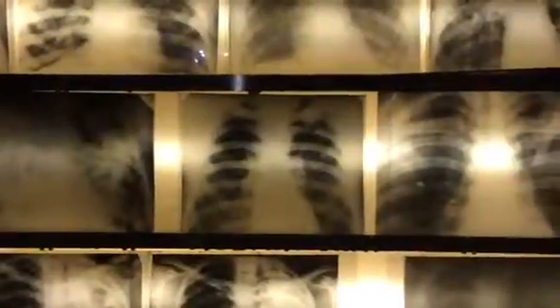On this X-ray, what do you see? You see foci of bronchogenic dissemination. And what is it? How do you say? Ghon. Yes, it's a Ghon focus. Primary tuberculosis complex, but on this X-ray you see fibrous cavernous TB. Fibrous cavernous can also be in primary. It's primary, relapse after primary TB. Can be a complication.